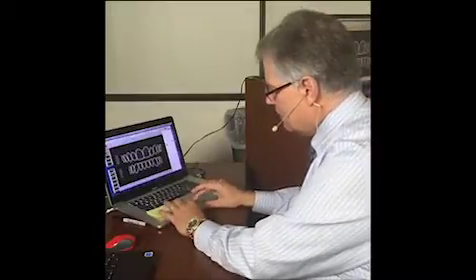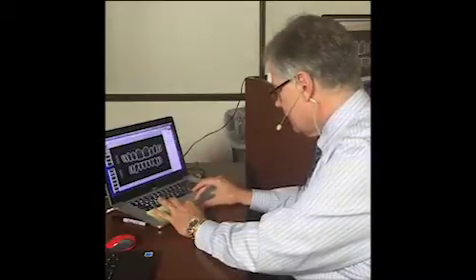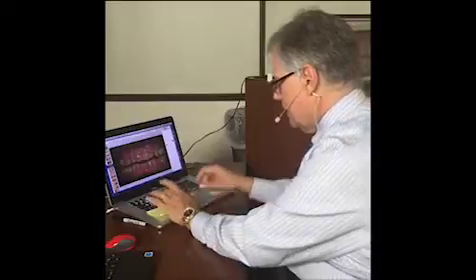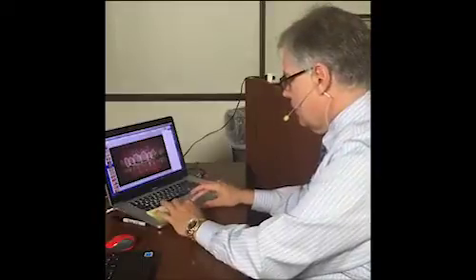So let's change Craig's 6 front teeth. I am going to hold down the click. It's a left click. Anything I touch with a rectangle as I drag in Keynote will be selected. I'm going to copy those. Command C. I could have gone to Edit Copy. I'll go back to the picture that is corrected and I'll paste them. Command V, there they are. Okay, I can now take this and do whatever I want with them.